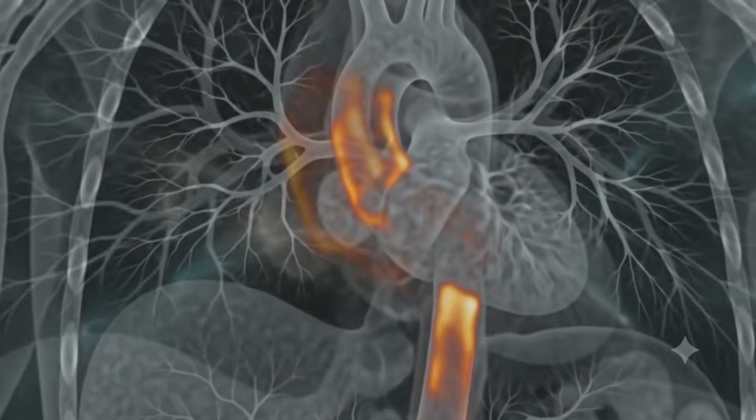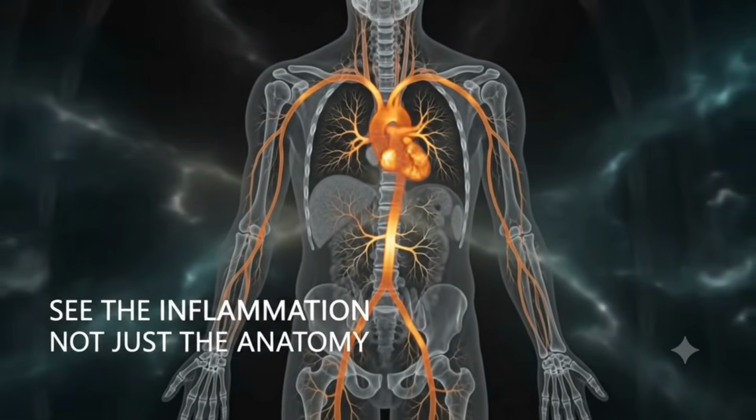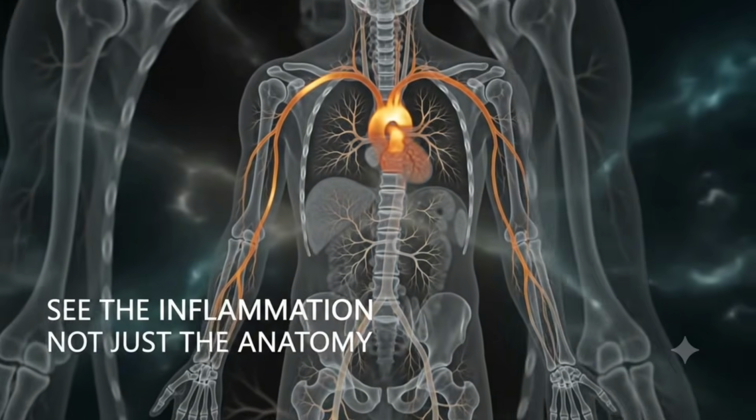Imaging should never stand alone. FDG PET can reveal the distribution of active vascular inflammation beyond what anatomy alone can show.